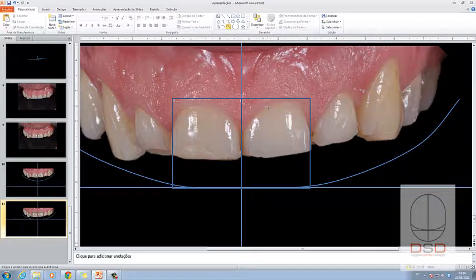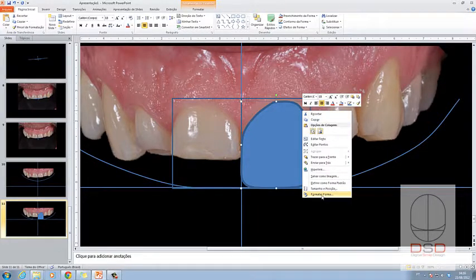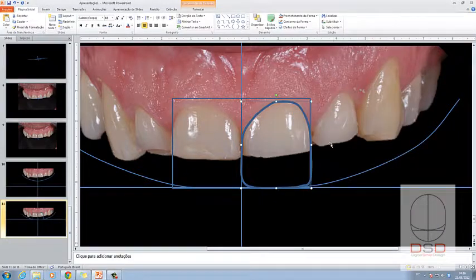Let's do it closer so you can see how the curve command responds to my mouse movement here. So, nice. Here, let's try to close. Now it's a closed polygon, and I'm going to right click, format figure, and then choose no fill.